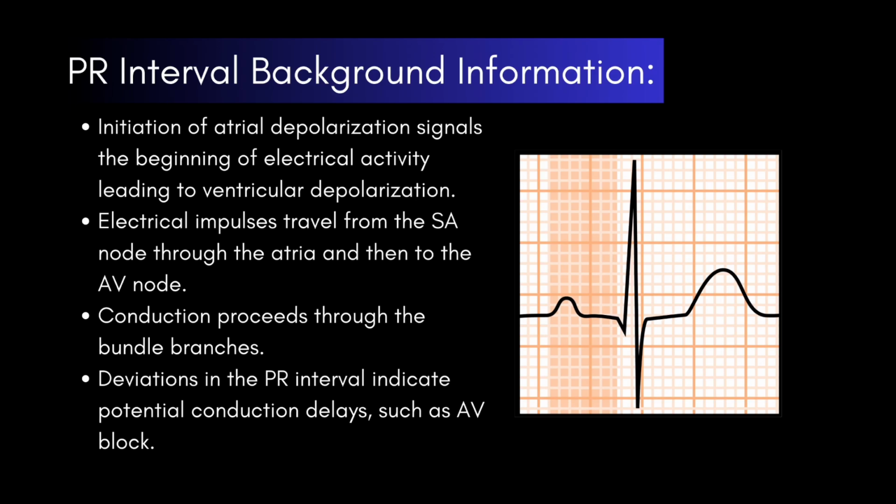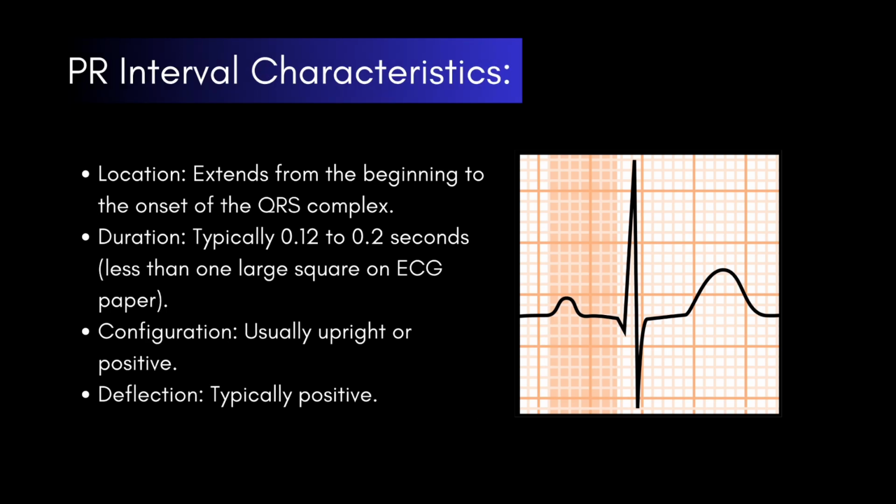And I have the picture to the right showcasing the area that consists of the PR interval for a nice visual representation when you're reading an ECG. Moving on, some characteristics of the PR interval.